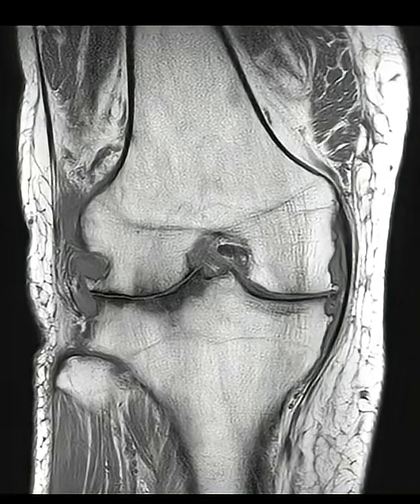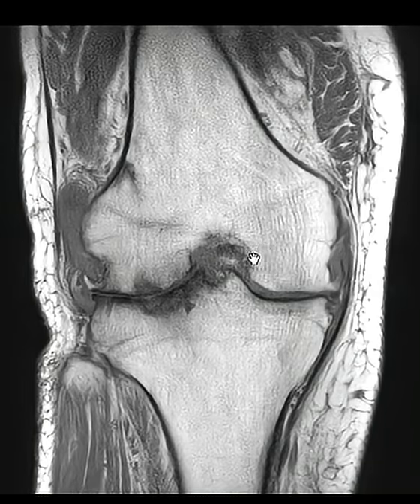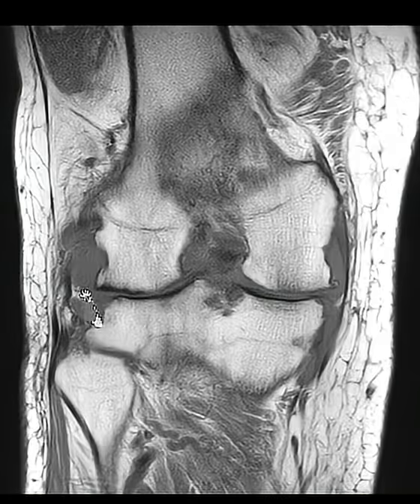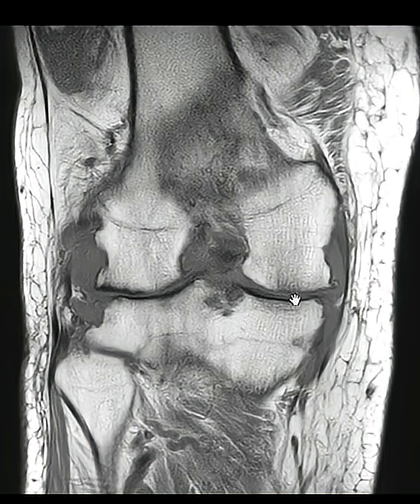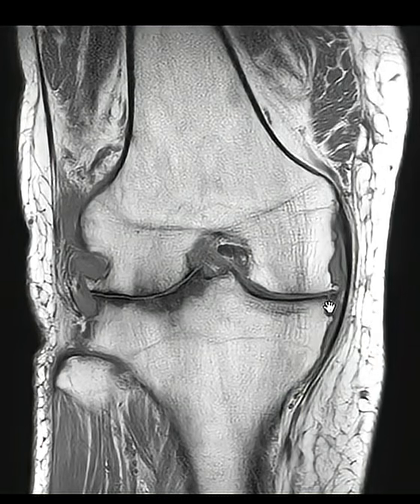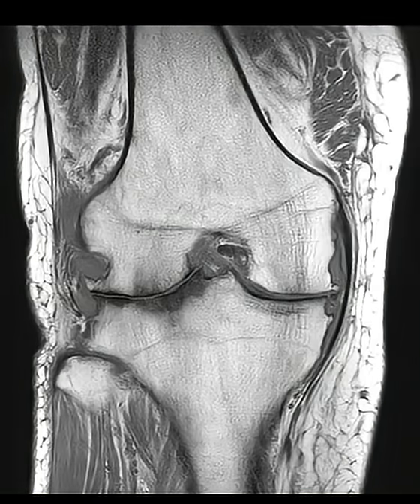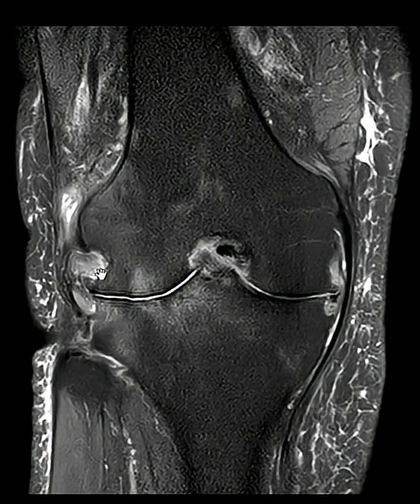Psoriatic arthritis also could produce this, so we throw that into the differential. But in a case like this where we see complete loss of cartilage, erosive changes, and then these enthesopathic erosive changes where tendons and ligaments attach. Here the joint capsule comes down and attaches, so it's right where the joint capsule attaches. The capsule is inflamed and it starts to erode the bone slowly. Same here, the popliteus tendon comes up right where it attaches, it erodes that, and we get these classic erosive changes that are away from the joint.